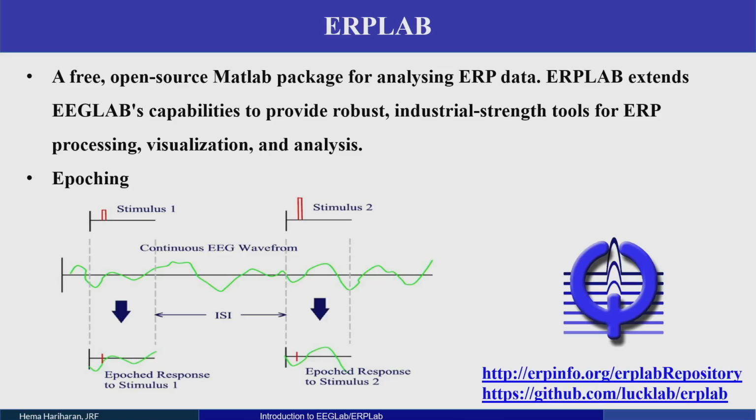Next we will have ERPLab. This ERPLab is also a free source MATLAB package, which helps in analyzing the ERP data. The whole EEG is a continuous whole data. Here, for example, the green waveform shown over here is the whole EEG waveform.